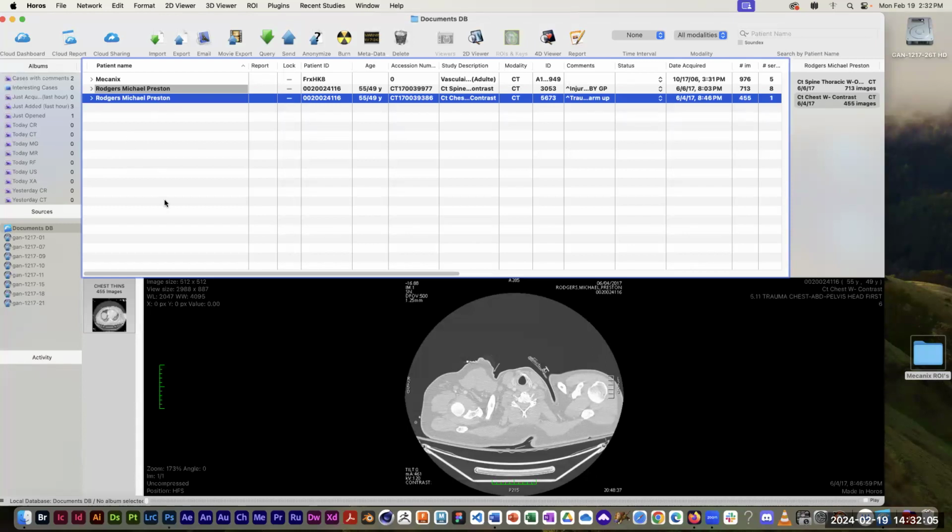So just to refresh your memory, if you were exposed to it before, or if maybe you didn't happen to be in that class or whatever. Segmentation is where you identify a particular structure that's visible on the cross-sectional slices in one of these data sets. And you isolate that structure from everything else. And you're then able to export a 3D model of just that structure. So it could be just one bone, just one organ, something like that, that you basically trace on the cross-sectional slices. And then you're able to then visualize that as a 3D model where you can see only that one structure that you've isolated from everything else.